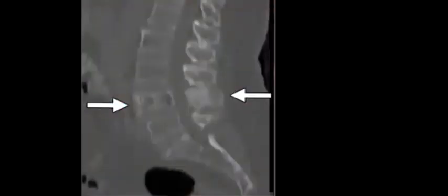Yeah, the answer will be, I should go to the CT image and check for the shape of the vertebrae, right? So go and check for the shape of the vertebrae clearly, without being affected by the PET color. So in this case, without being affected by the color, it could be not metastasis. Hiba, perfect.